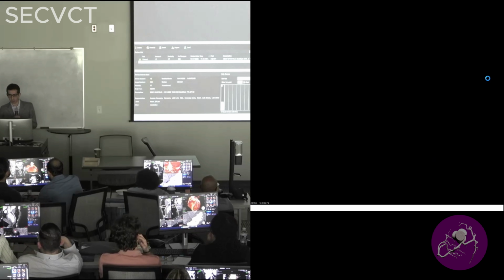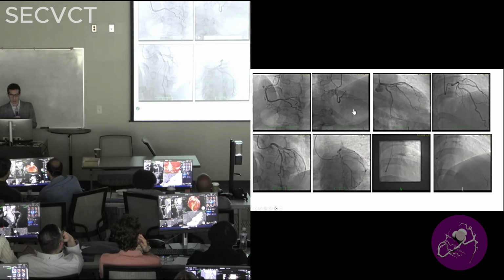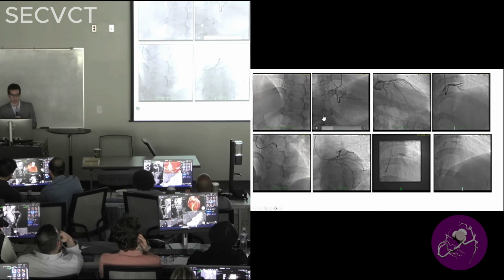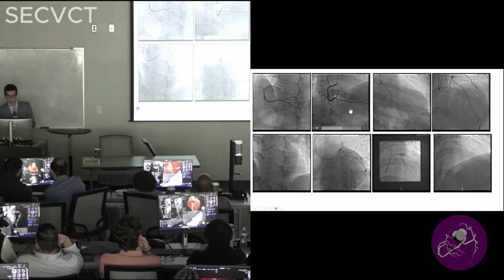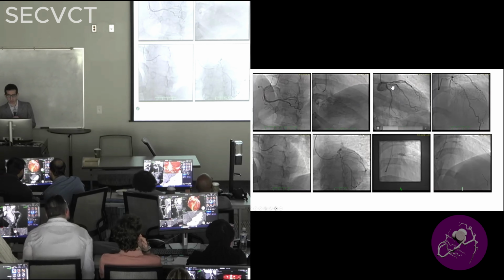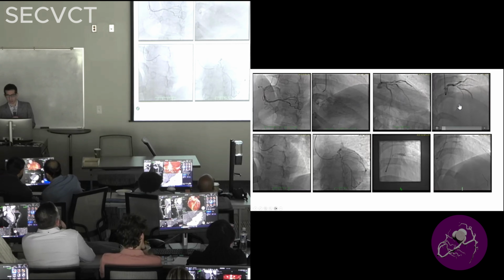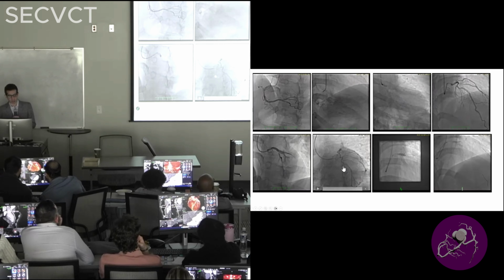So anyway, I'll show you his angiogram, RCA. Again, let's look at the PDA. We talked about it before. There was some small narrowing, and now you can appreciate it's very small, but not worth intervening. But here's the money shot. Look at that proximal LAD, just right before it gave that large diagonal. So again, severe stenosis of the LAD, non-calcified plaque.